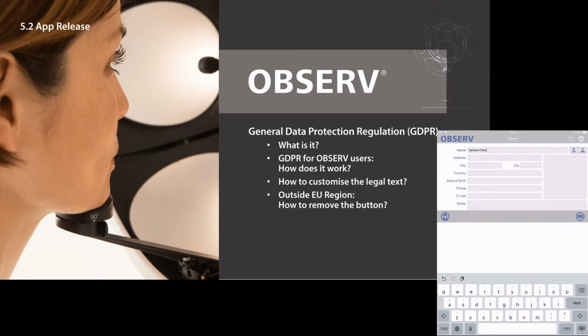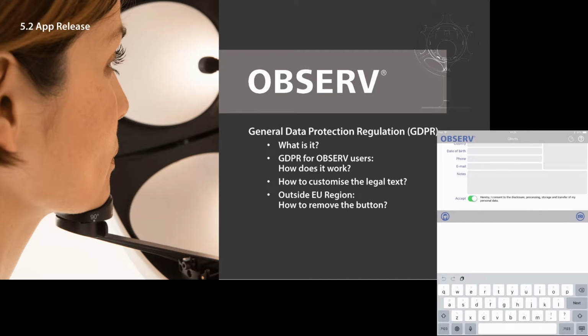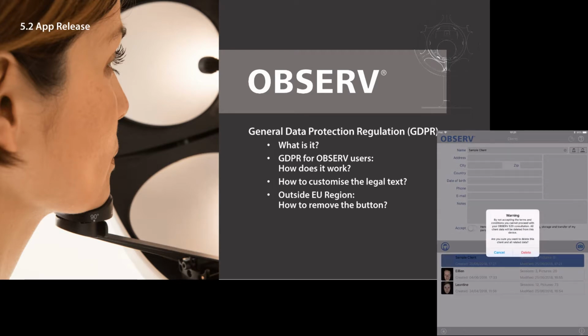Only when clients accept the stated terms and conditions, the consultant will be able to pursue the OBSERV consultation. This means that you cannot go into the live view before the client has agreed to the terms and conditions. If you attempt to go into the live view, you will get a pop-up notifying you that you have to agree to the terms and conditions first. Important point of attention is that once a client has agreed to the terms and conditions and at any point decides to disagree, you will get a warning pop-up that all client data will be deleted in order to comply to the privacy law.